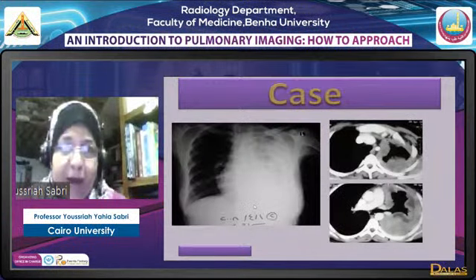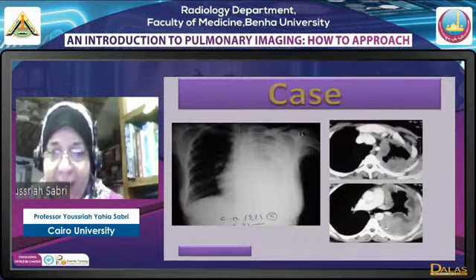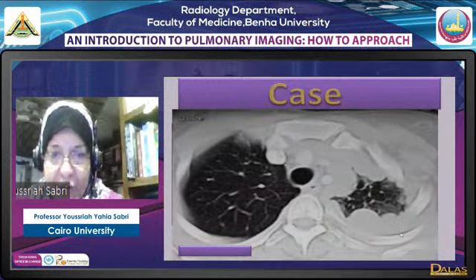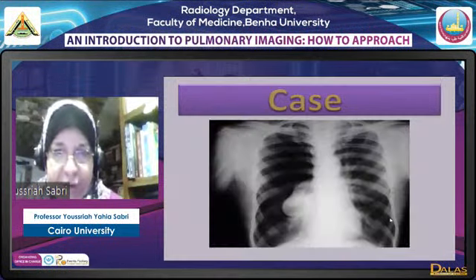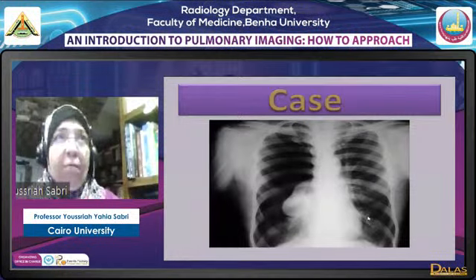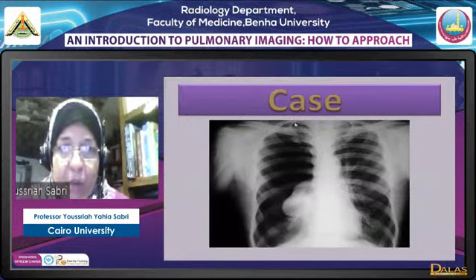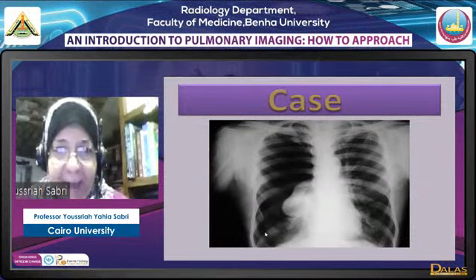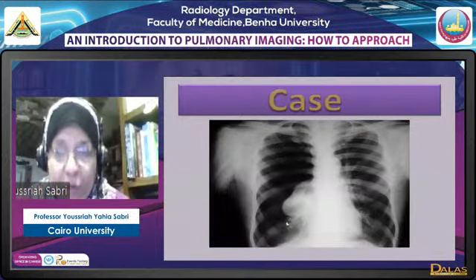Here we have an opaque hemithorax. In axial images, we have the nodular circumferential thickening of the pleura, classic for mesothelioma, giving again in the plain film an opaque hemithorax. Now shifting from opaque to black hyperlucent hemithoraces, we have this classic appearance of a jet black right hemithorax with a total collapse of the lung.